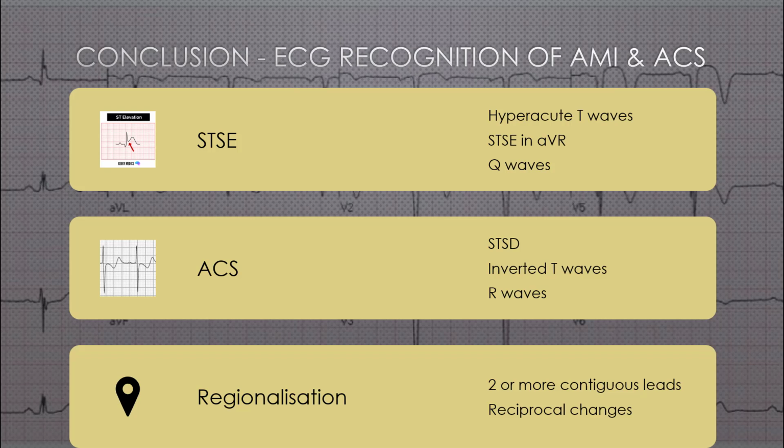The hallmark for an acute myocardial infarction is ST segment elevation, but we know between half and two-thirds of the people that are having an AMI are not going to produce these changes. On top of that, even 50% of the STEMI patients have inconclusive findings with the first ECG that's taken. In terms of acute coronary syndromes and non-STEMI, patients require biological markers such as troponins to identify whether or not they're having an infarct. In the short term for paramedics though, we can raise the level of suspicion by looking for those subtle T-wave changes such as we see in the Wellens sign or the T-wave inversion where it shouldn't be, particularly when it's in contiguous leads.